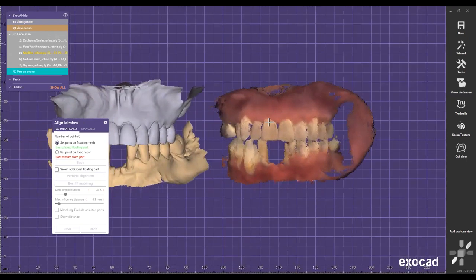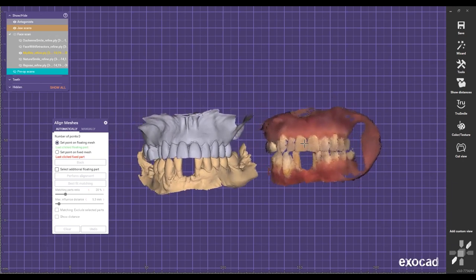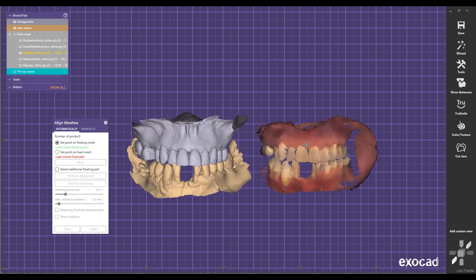We have a workflow that we have developed with our facial scanner that no other facial scanners on the market can do, and this is a huge advantage, having an option to acquire the bite with such a scanner, because we can nail the bite right away. That's the nice thing, especially for full arch cases, or full mouth reconstructions or dentures, or especially for those patients that come with very bad teeth, right? And it's a challenge to scan the bite, especially with an intraoral scanner.